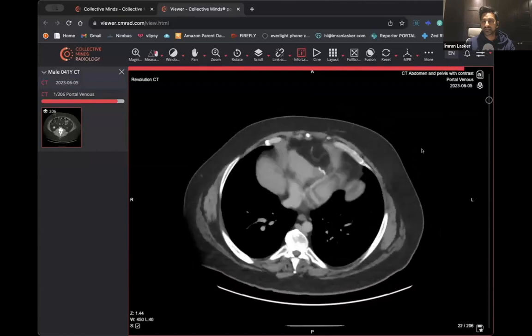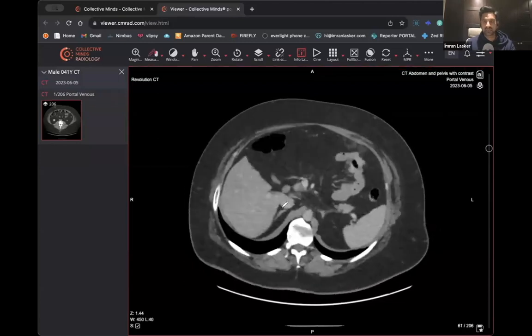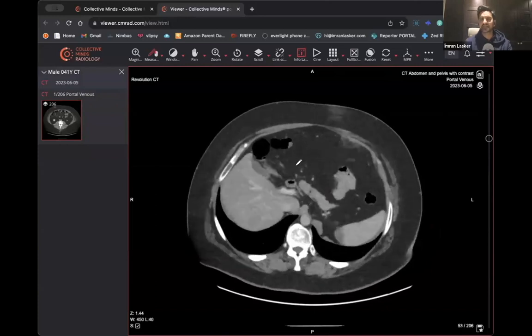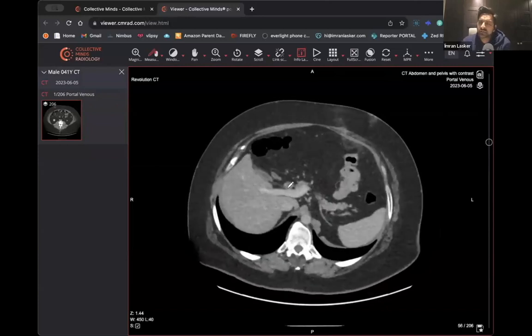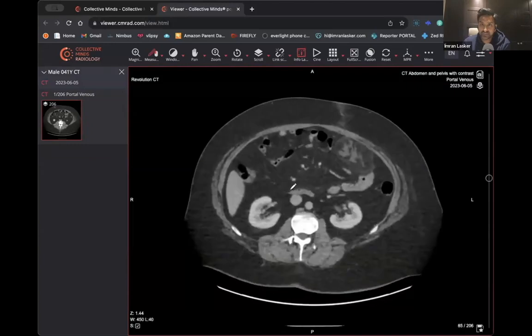Right, so let's have a look. Contrast in our study? Yeah, contrast, I think so. What phase? Let's look at the portal vein. The portal vein is there. That looks slightly brighter. Someone said lots of fat. Whereabouts? Everyone's got a bit of fat, don't they? So then you've got your portal vein there, and you've got the aorta that looks like that. This is brighter, so this must be a portal venous phase image.